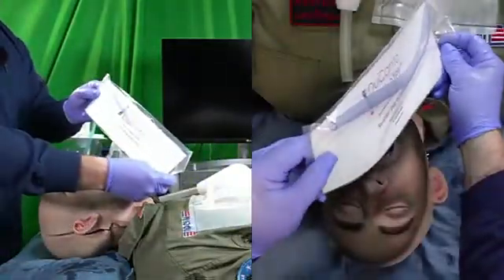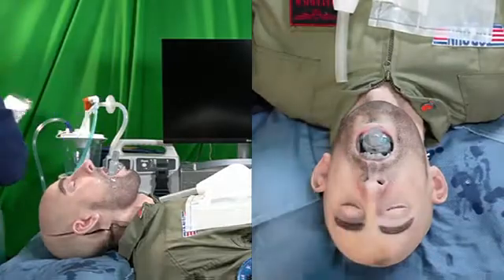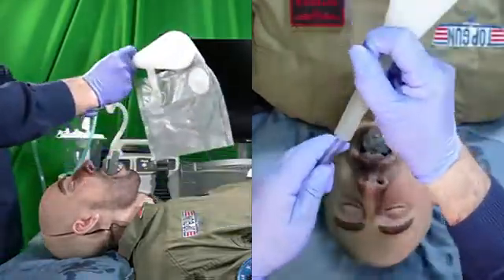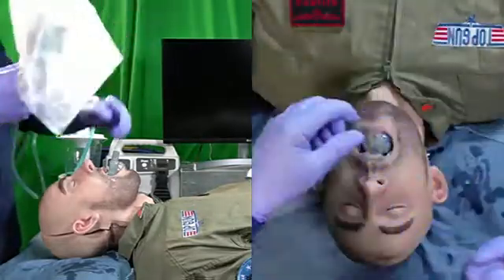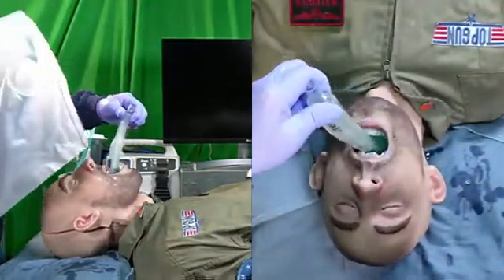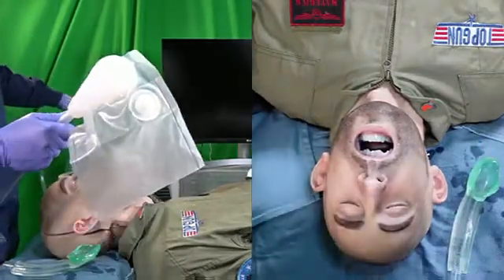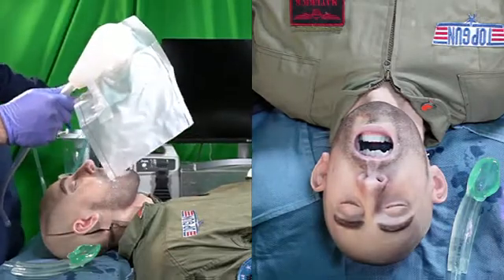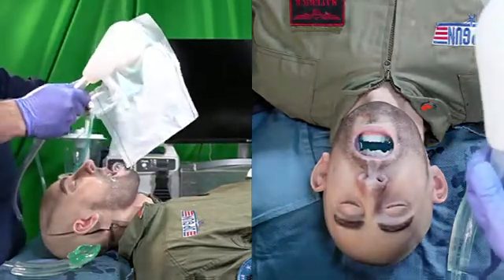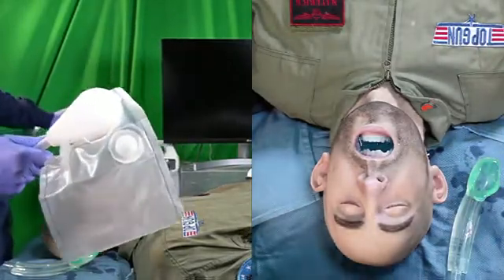You take the Ducanto catheter out of the package and put it straight onto the suction device itself. And what this is going to allow us to do is anytime we need suction, this device is going to be there for us. So let's recontaminate this airway and do this simulation from the beginning. We're going to really muck it up here. Okay, you can see the mannequin's got a full mouth of airway contaminant now.